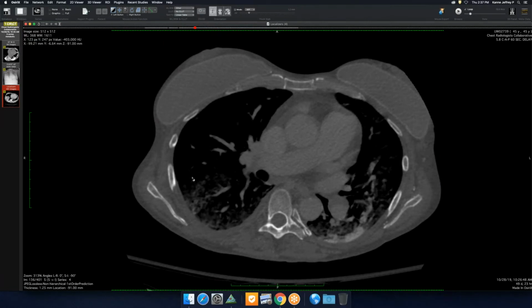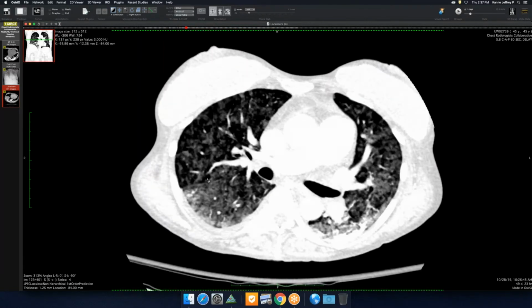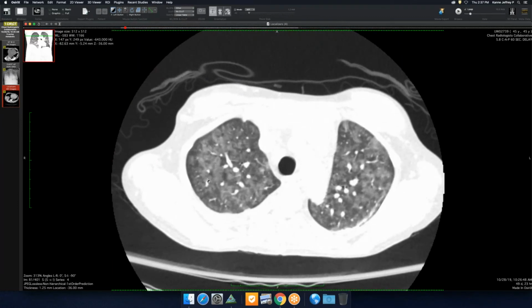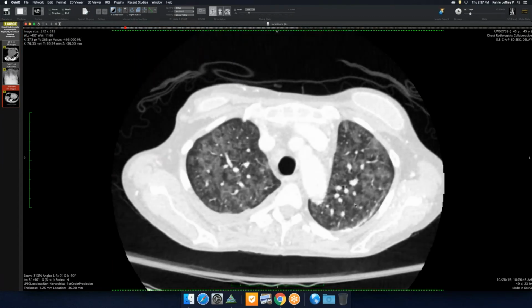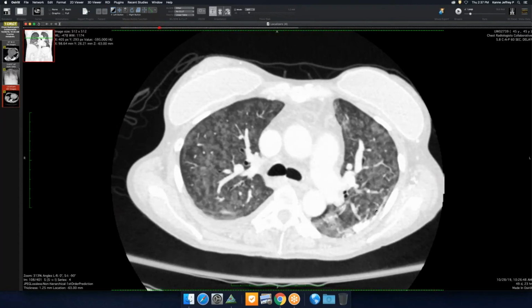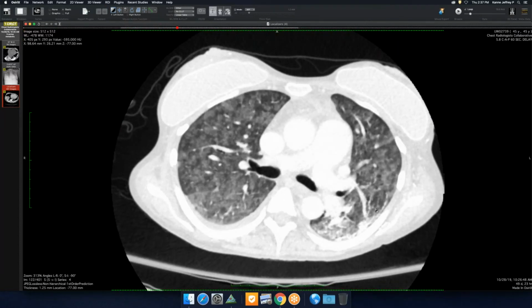Go ahead. What do the upper lobes look like? Because it's not, you're right, it's not like the typical or classic tumoral or metastatic pulmonary calcification you see with that apical gradient where you have more calcium in the upper lobes. There's a denser band here around the rim. Yeah. But with the history, go ahead.